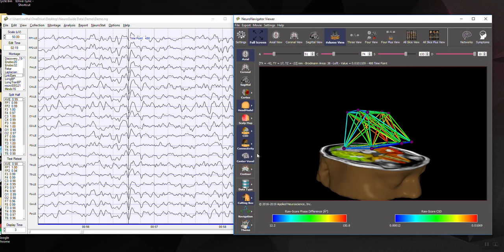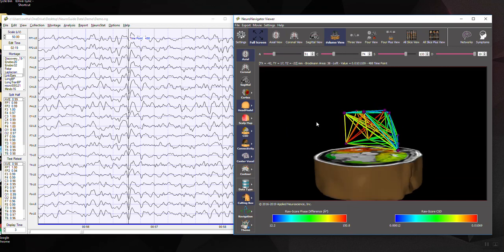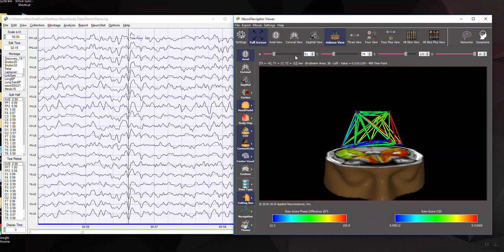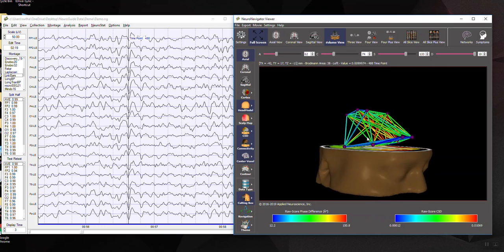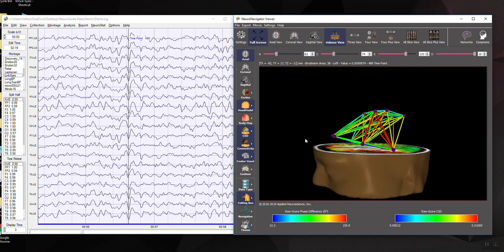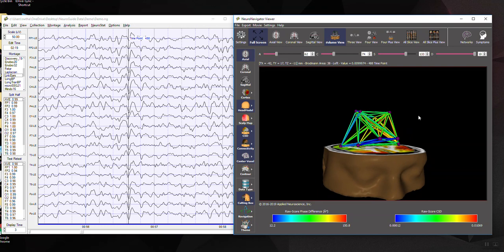I don't believe we have phase slope index yet, which is effective connectivity, measuring the magnitude and direction of information flow using the phase slope index. But in any case, this gives you an overview of the time domain capture tool that supplements the old Key Institute time domain capture tool that was limited to the current densities only and did not provide networks.